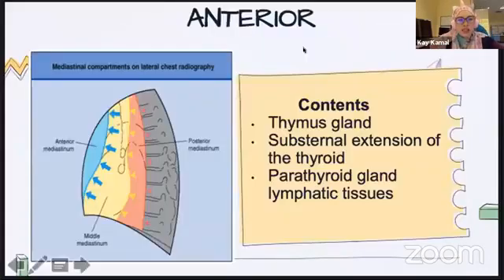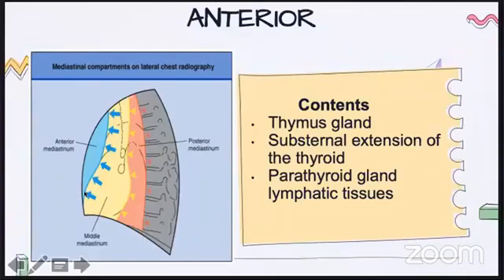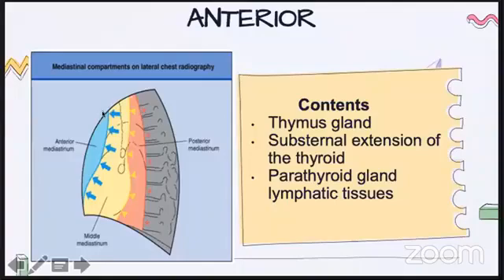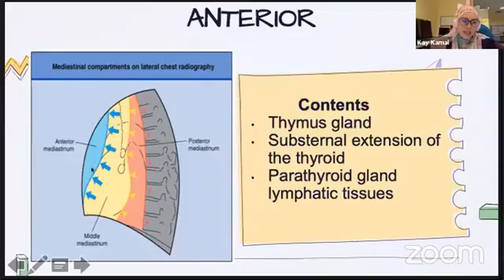So what is the anterior mediastinum? The blue color one is the anterior mediastinum. So everything that is forward and superior to the heart. The yellow thing is the heart, and everything superior to it is superior and forward, meaning in front. The heart is not considered as the anterior mediastinum. So it is bounded by the sternum, the first rib, and then the anterior heart border. This is just an imaginary line. You just assume it is there. And then the brachiocephalic vessels up here, and then the diaphragm all the way to the thoracic inlet. So this is our anterior mediastinum.